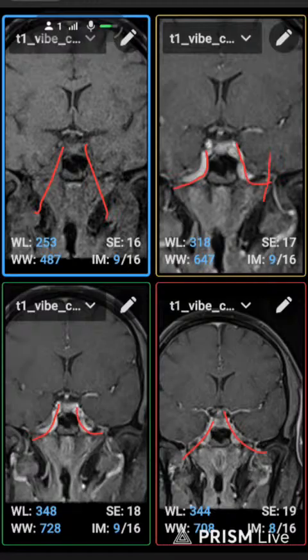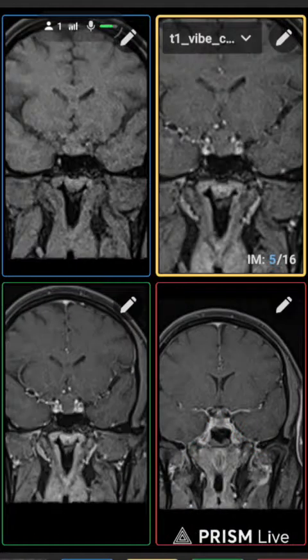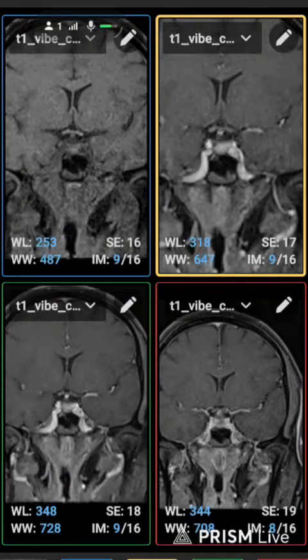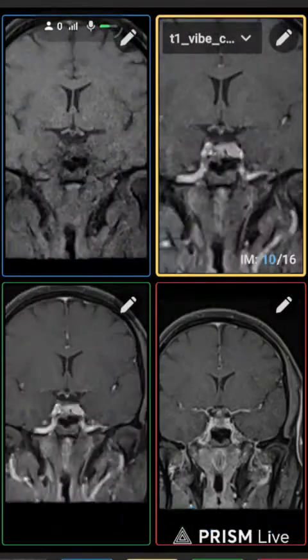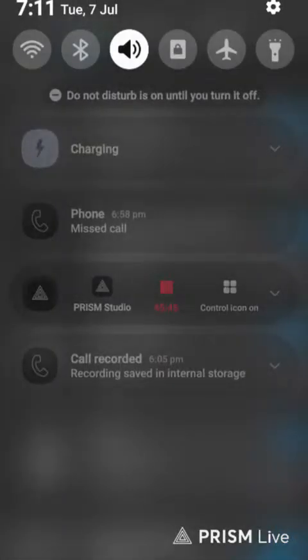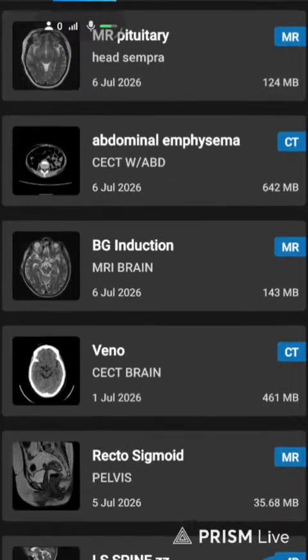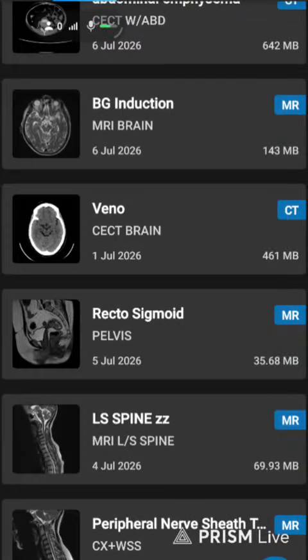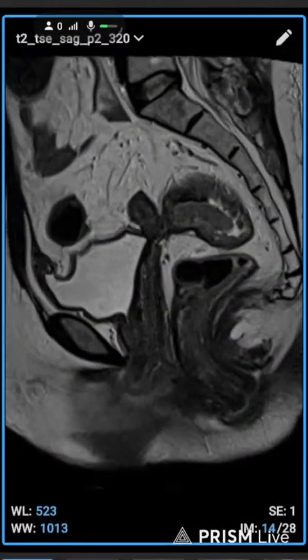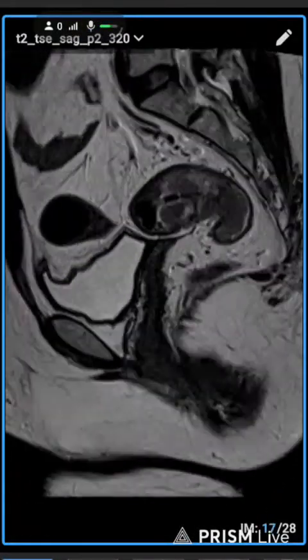We take multiple slices just because if there was any type of lesion enhanced in arterial phase, we will see what the delayed phase shows, and lots of different tumors enhance differently, so we need a dynamic study. This session is about 45 minutes and we are just showing one thing.